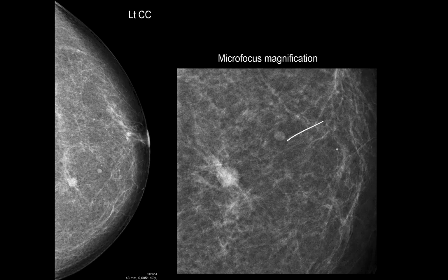And here is another one. That's low density, very sharply outlined. This is higher density, and it didn't shave for a week, so it must be a cancer.